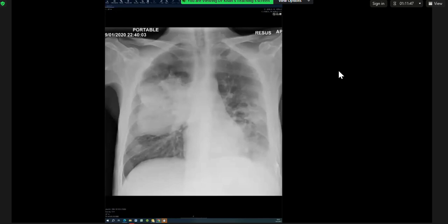So I would like to review the clinical history of the patient and see if previous X-rays were done to compare the course of the disease. I would like to communicate the findings with the referring physician and ask for a further CT for more characterization.